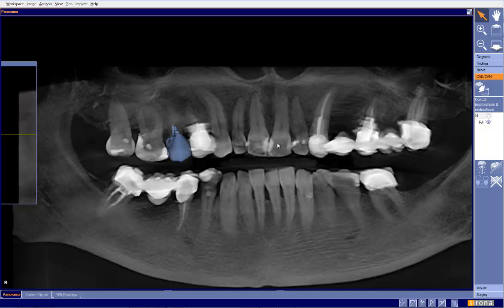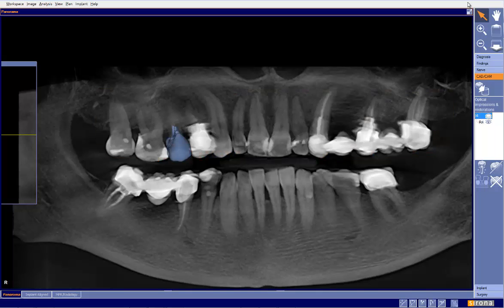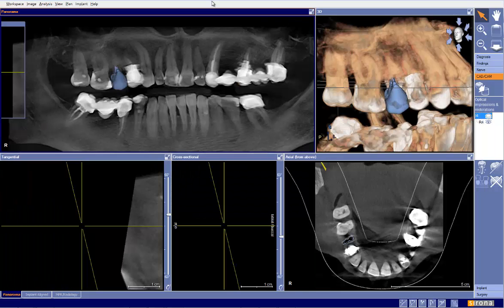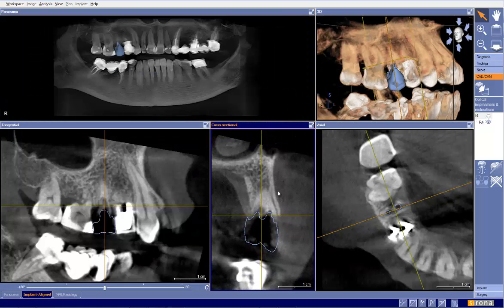And as long as we can get good integration with non-metallic restored teeth, circumferential metallic restored teeth, we should be able to do a traditional OptiGuide on this situation. And that's, again, redone here with the CEREC data. So all the things are in place here to be able to do a wonderful job on this case. So let's go ahead, and our plan is very nice here. Everything's seeing here very quite nicely.